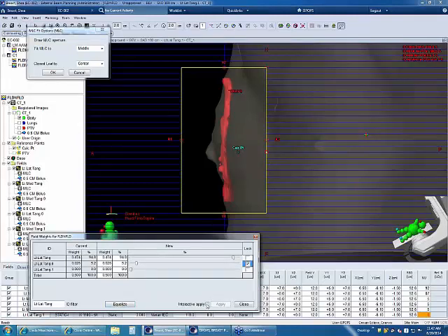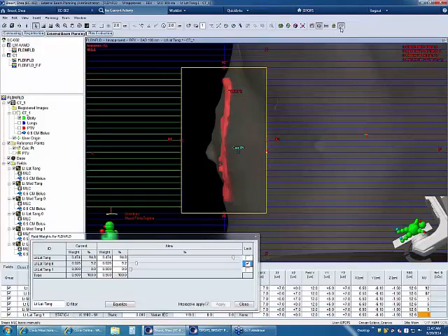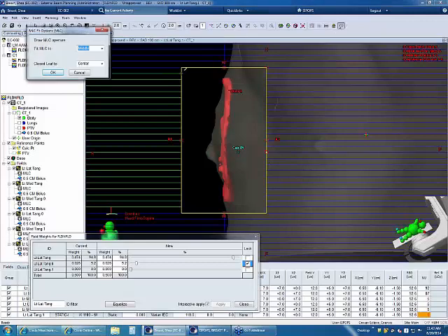I've caught myself before not doing that, and then I had to go back and change things. Take this off. My leaves are selected, so I'll take that, hold my shift key down, highlight this one, get my drawing tool, come back around now, and draw behind my isodose line here.